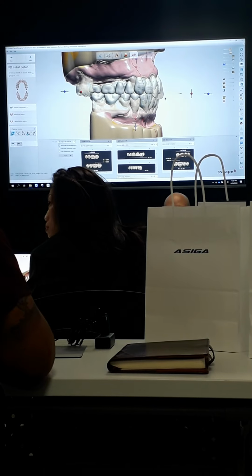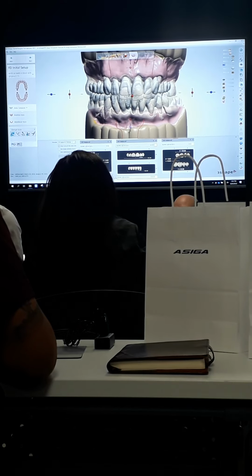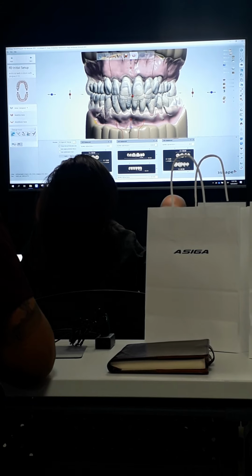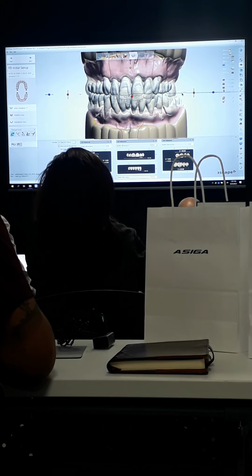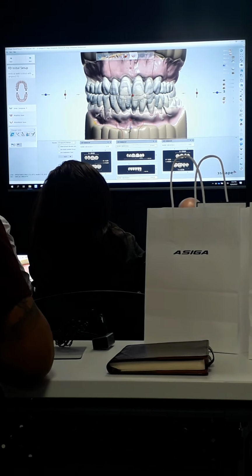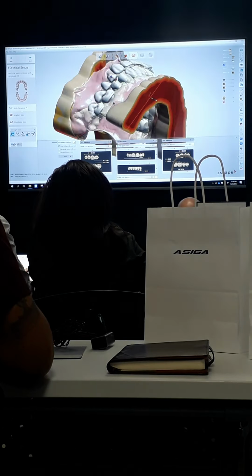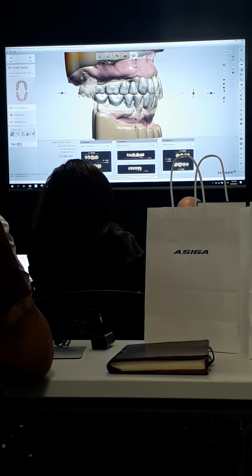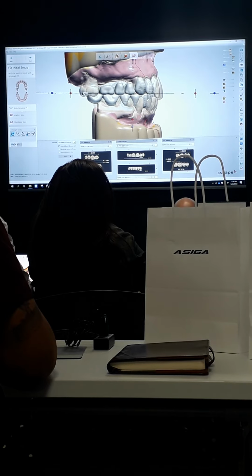Alright, so I positioned mine forward into position. I can see now that when I look at it from this view, I might be too narrow based on the positions of those two posterior molars. So rather than moving the individual teeth out, I can just take the green control point here and stretch it. I can also see from a side view that the position of this last molar here is too far forward from this molar. So maybe I want to grab this control point and stretch it back.